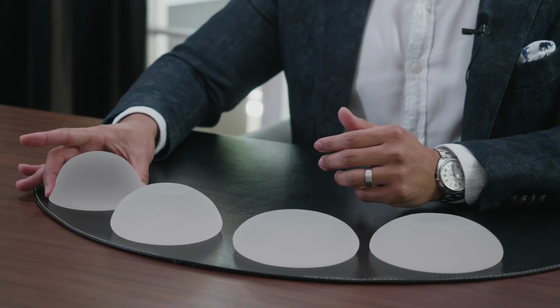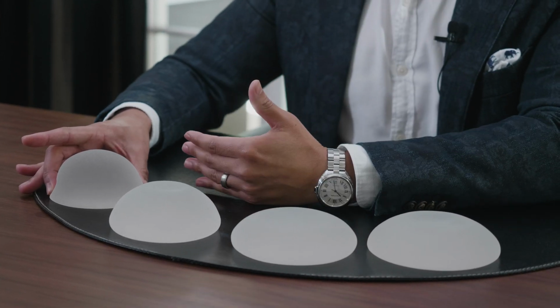So in terms of maximum size, ultimately, yes, there is a maximum size that patients can have based on their breast width. I'll use an example of a patient who has a 13 centimeter width here, and that is 13 centimeters where we can sit an implant on. We don't want to put in an implant that's 14 centimeters because we're going to end up going over that and end up in the armpit. So if you want to know the maximum size that you can have as a patient, you look at your breast width and you look at the ultra high profile because that's how we can get our maximum volume in.